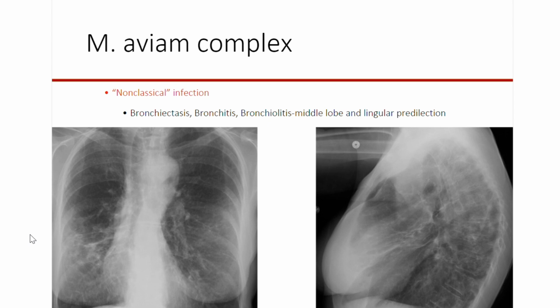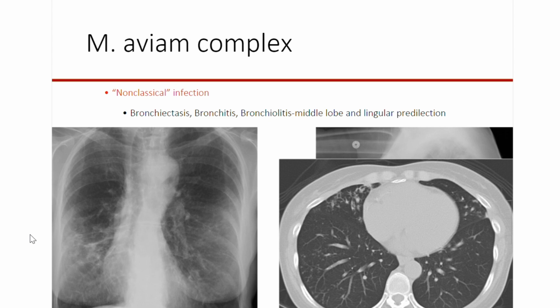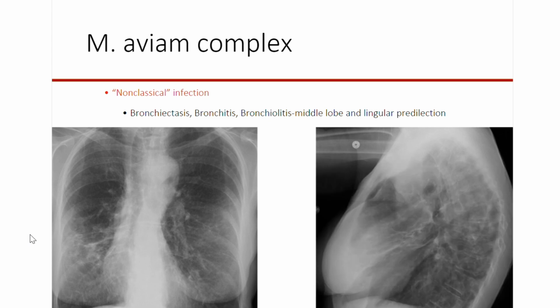So basically, for the last 20 years of their life, if they're symptomatic, they're coughing, they're losing weight, they have bronchiectasis. And we know that if you have bronchiectasis, you're predisposed forever to Pseudomonas infection and a wealth of particular organisms. So this is a typical MAI patient with silhouetting of the right heart border and the left heart border, so we know something's going on in the middle lobe and lingula, right?